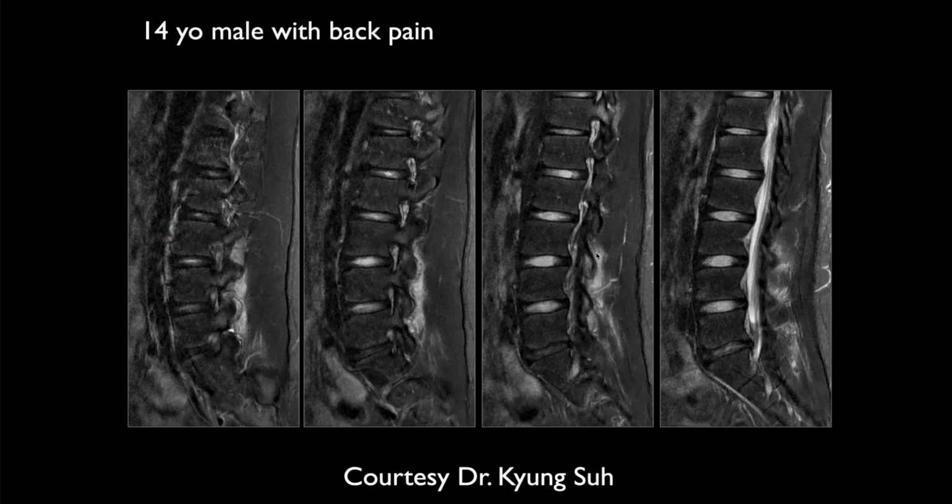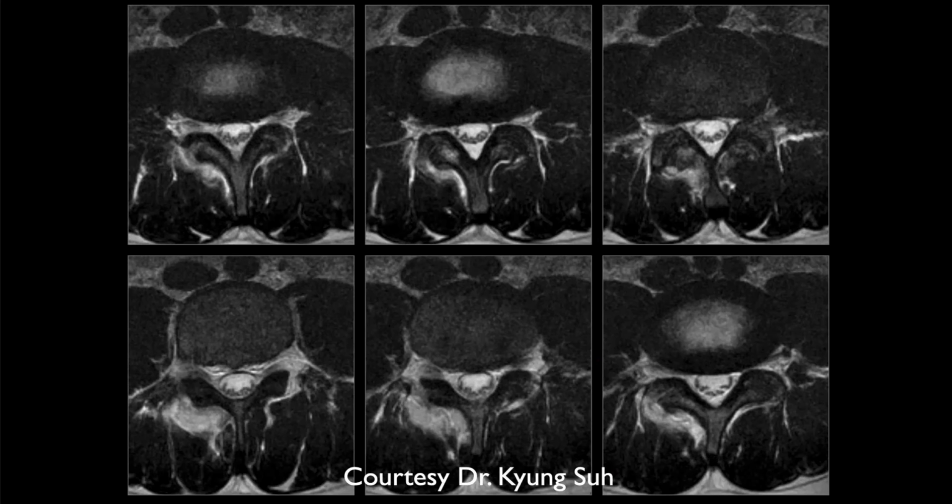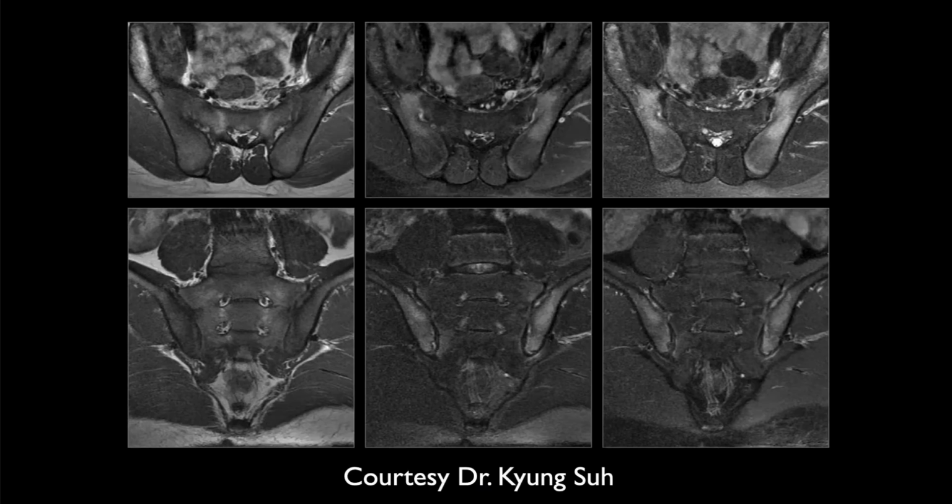So you're concerned about this, but the really concerning thing here is the edema adjacent to the posterior elements, the facet joints. And if we go to the axial images, you can clearly see that there's a lot of edema around the facet joints, especially on this right side, which is very abnormal. In a 14-year-old with pain, if you're a clinician, you'd want to check to see if it's inflammatory type pain, like we just talked about. But this is highly suspicious of an inflammatory arthritis. And at this age group, the most common one by far would be ankylosing spondylitis.